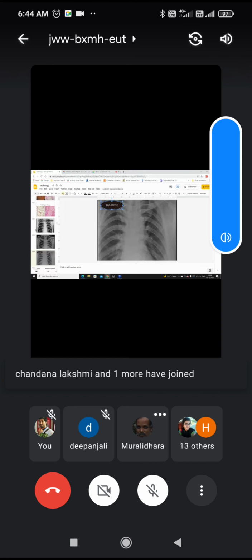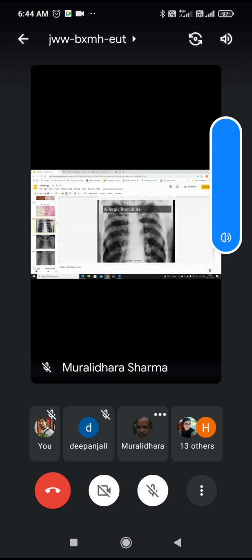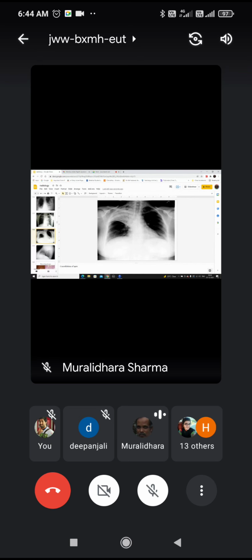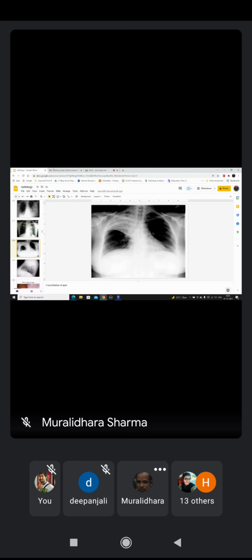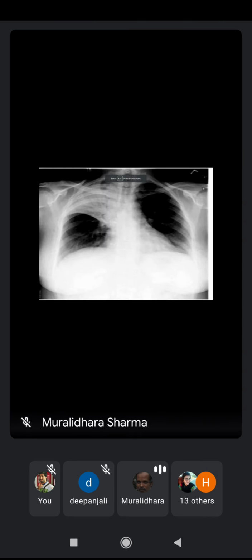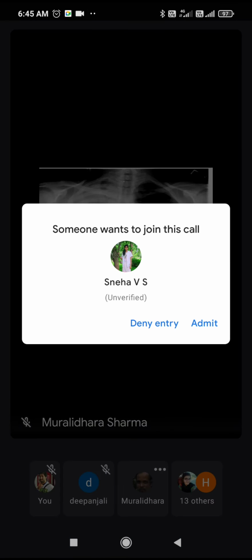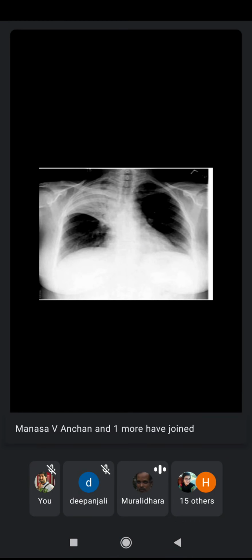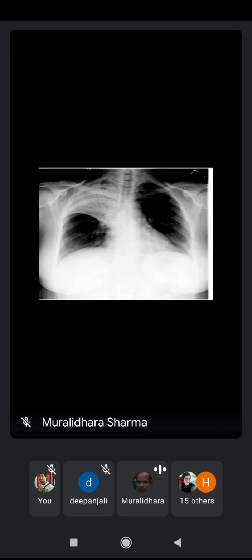We were discussing the fibrotic changes in the lung tissue, and we are seeing some examples of fibrosis occurring in the lung tissue. Now, we will continue from that point. In this X-ray, you can see evidence of reduced air entry, and it has a border corresponding to the superior and middle lobe area, the interlobar area.